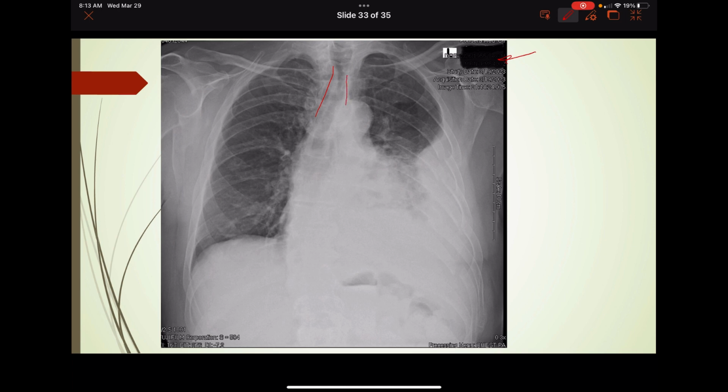And trachea coming down. Looks like the carina is probably right in this area. Bones look okay. Cardiac silhouette, you can't see much at all here. Diaphragms, here's right diaphragm, can't see left diaphragm. You see gastric bubble down here. Good airway markings on this side, airway markings up there, but you can see there's a big pleural effusion here.